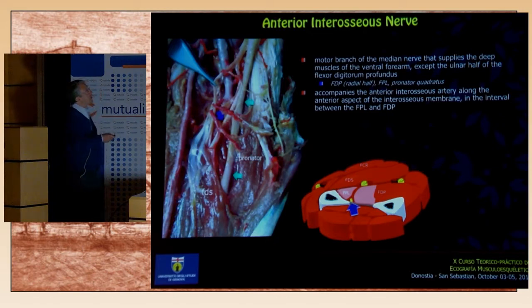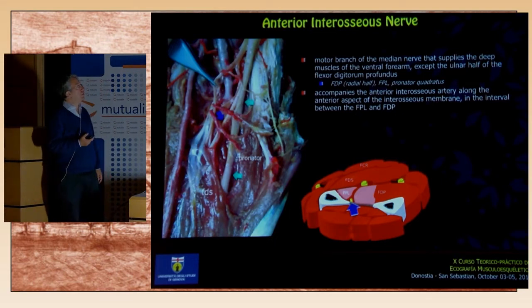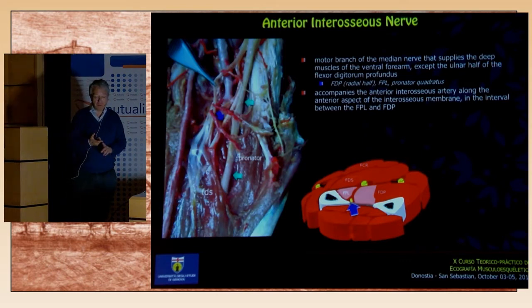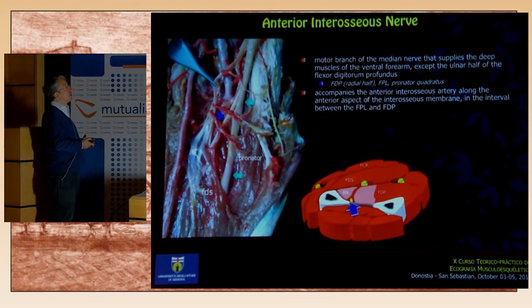Look at this picture. It is really very complex, and you see a lot of accessory structures potentially compressing small vessels. The point is that, again, ultrasound is not really sensitive to evaluate the nerve directly, because the nerve is too small. If there is a band, the band is not visible. A fibrous band is not visible, and the nerve is too small to perceive an abrupt, sudden change in the orientation of the nerve trunk.